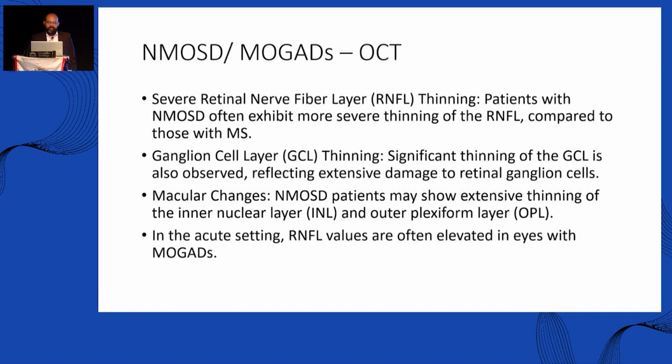Yeah, so as I said, there's more severe retinal nerve fiber layer involvement in NMOSD, and also there's relative sparing of the temporal field in the peripapillary RNFL layer in MS compared to that of NMOSD, which is more extensive, involving both the inferior and the nasal quadrants.